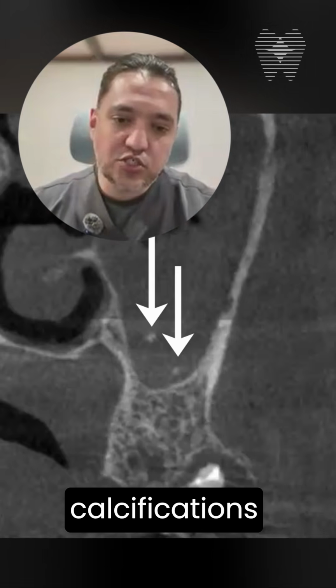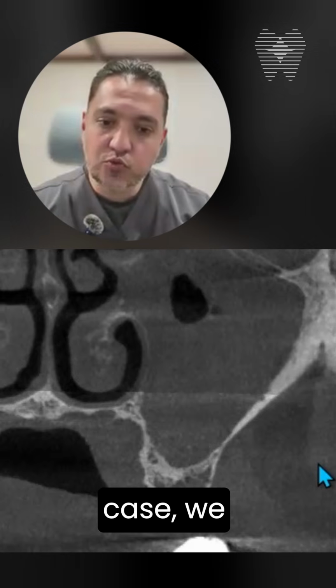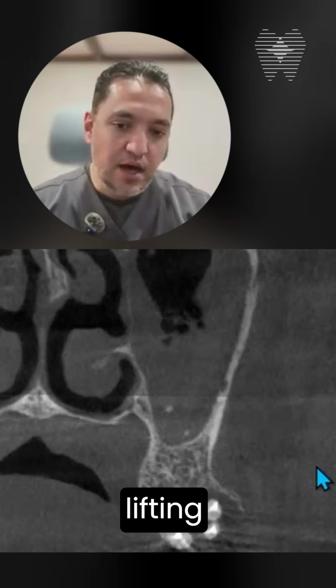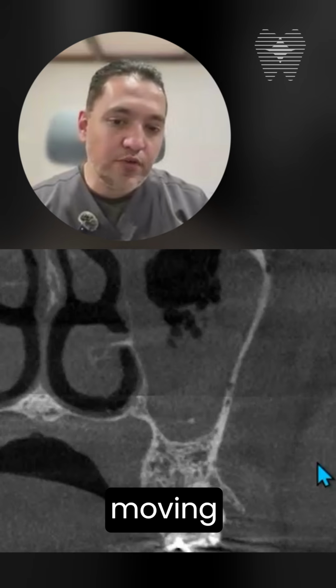However, the calcifications on the floor of the maxillary sinus are suggestive of most likely a sinus disease of fungal origin. So in this case, we recommended not to proceed with the sinus lifting until the patient is referred to ENT to resolve the sinus issue before moving forward with a successful sinus lifting.